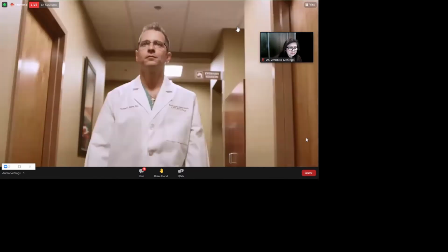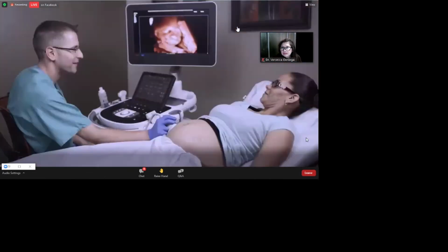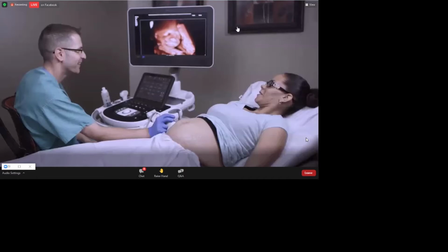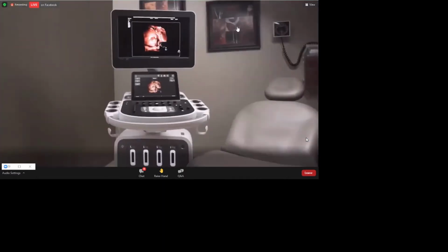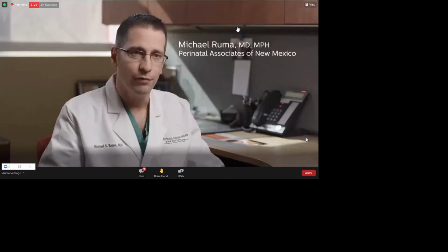My name is Mike Ruma. I'm a maternal fetal medicine specialist. I work at Perinatal Associates in New Mexico, and what we're going to talk about today is the Epic and Affinity ultrasound platforms, the latest release of software, which incorporates a variety of new features.